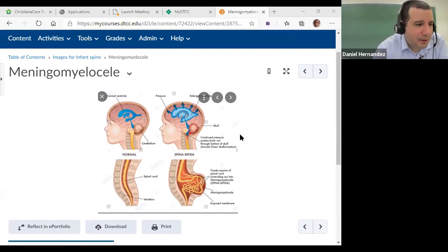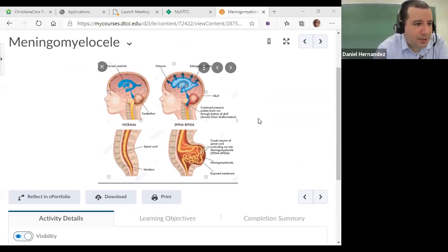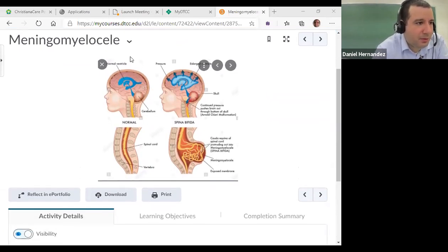This was another picture showing myelomeningocele, with your normal spinal canal and brain anatomy. There are a couple of different things that can occur with spina bifida. If a patient has a Chiari malformation, we have dilatation of the ventricles, which creates pressure within the brain. These ventricles are dilating, putting pressure on the skull, so everything gets pushed caudally now.